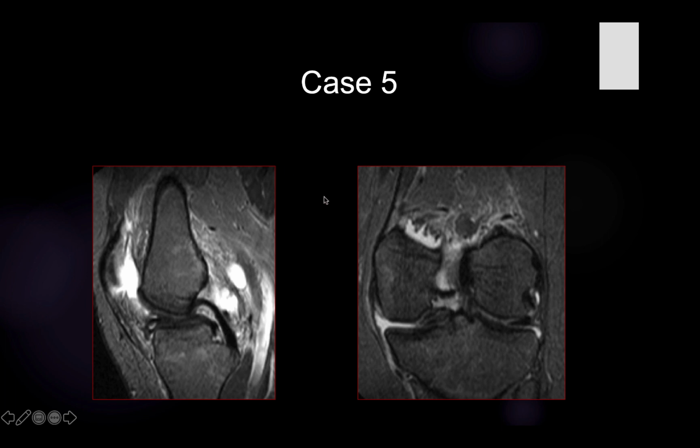This is called bucket handle tear of the medial meniscus.